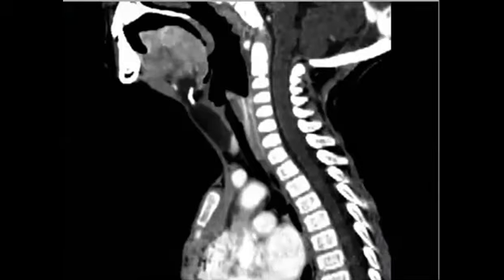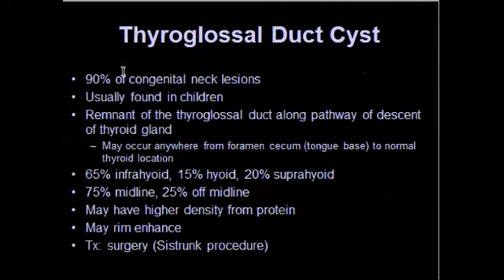One of our stars here, yes. So thyroglossal duct cyst, midline cyst. And here they like to mention that you can see this component below the tongue base. So this one is above the hyoid and this one below the hyoid. They are connected together. Yeah. So this is what is called thyroglossal duct cyst.